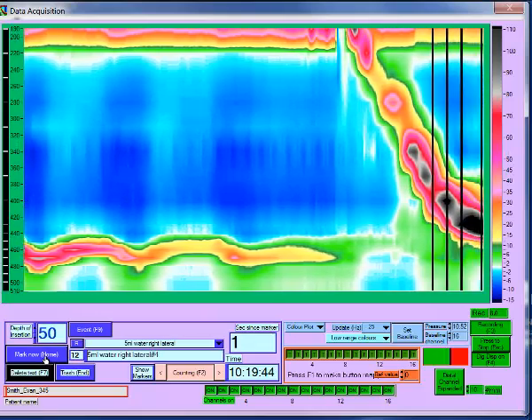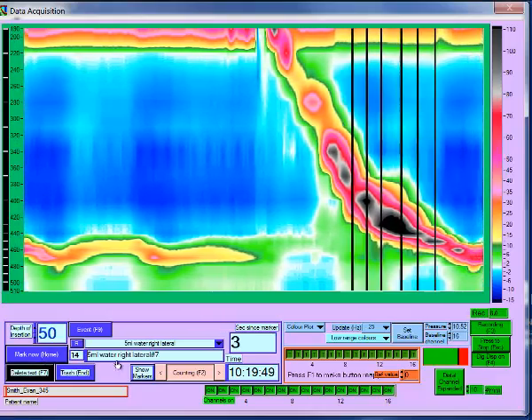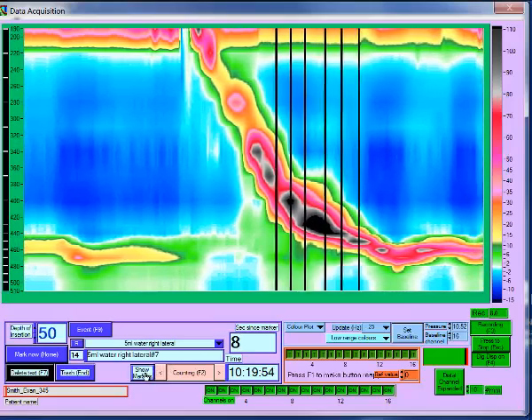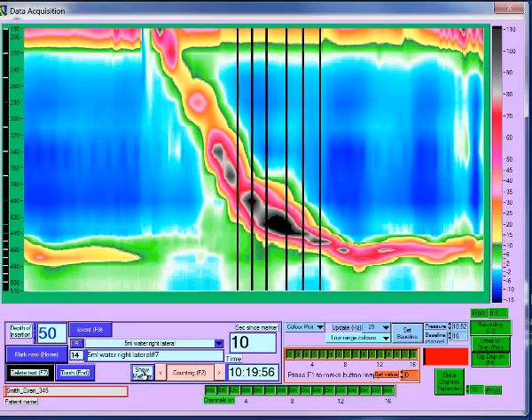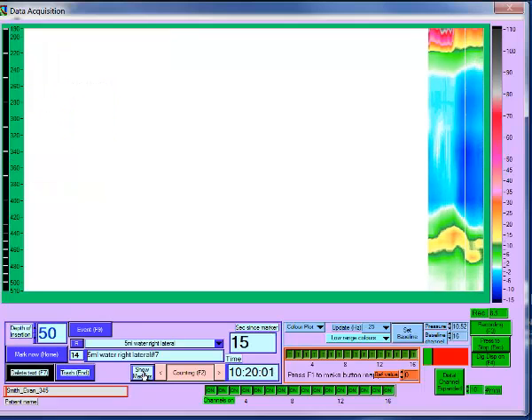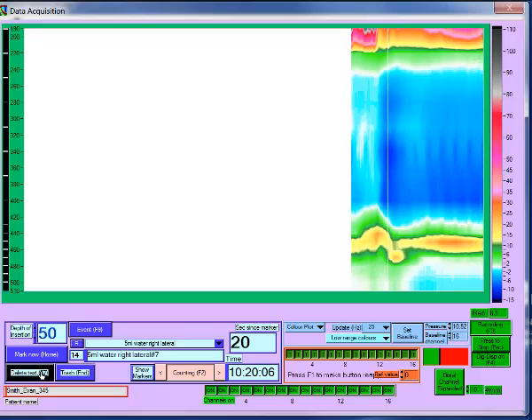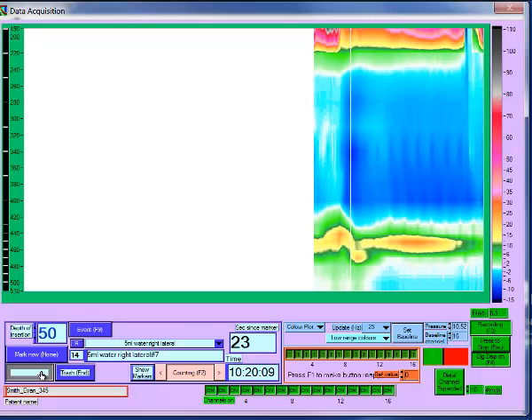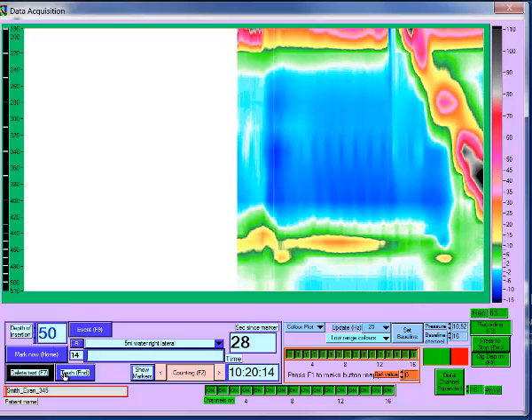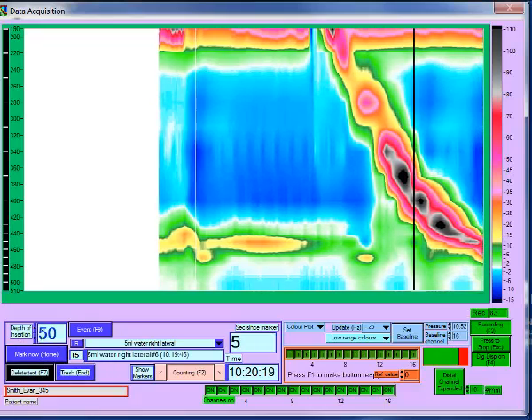When counting is activated, each press of the Mark Now button both enters a marker and increments the number at the end of the marker. You can show previous markers that you have entered by clicking on the Show Markers button. Clicking on the Delete Text button will clear the marker text box, and clicking on the trash button will delete the previous marker in the analysis display.